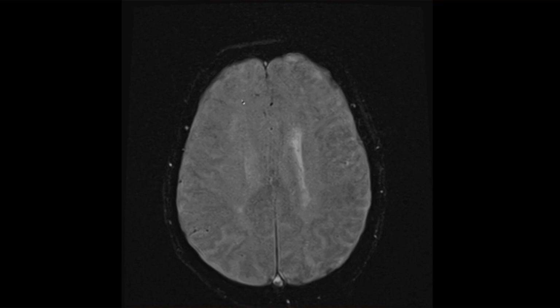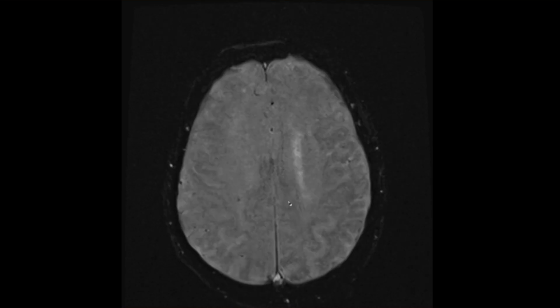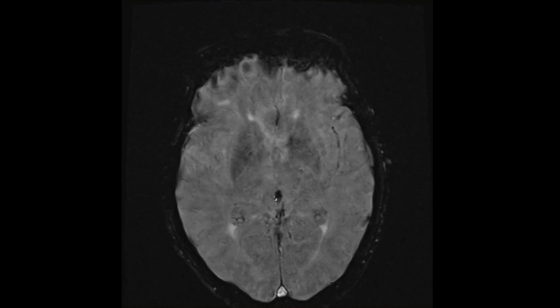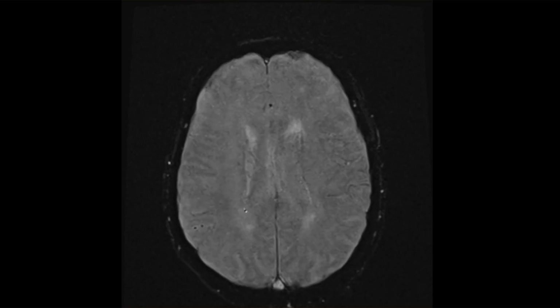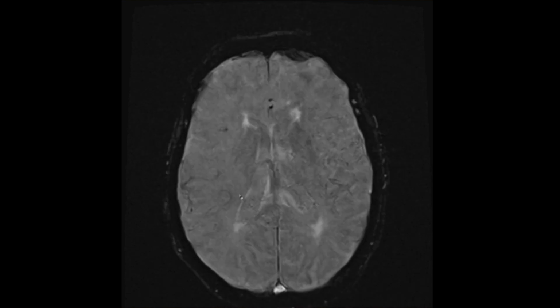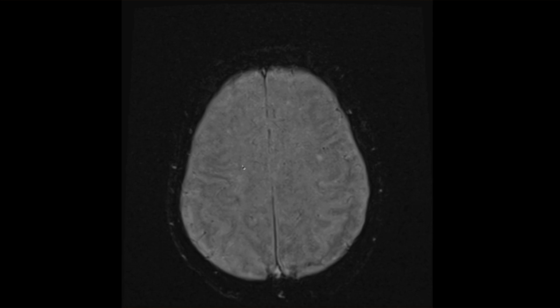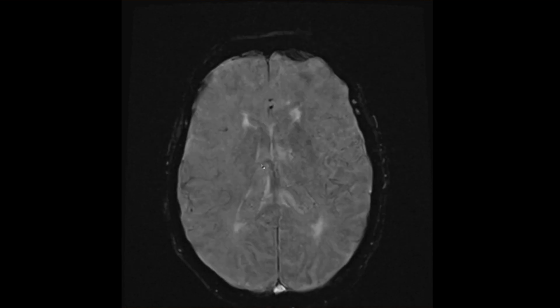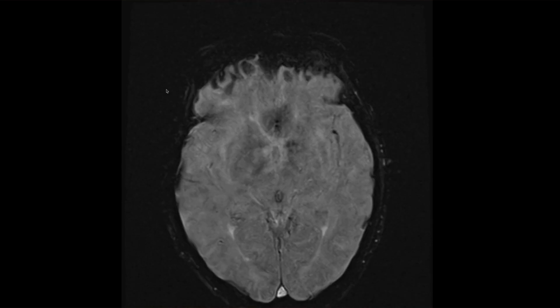Sometimes you can also see areas of microhemorrhage at the gray-white interface in patients with traumatic brain injuries, axonal injuries, that type of thing. You can also see a lot of these areas in people with cerebral amyloid angiopathy. I think there are a few studies showing that you can predict different types of dementia, maybe with this burden of susceptibility artifacts. Could be related to old injuries too sometimes. You just have a little microhemorrhage.